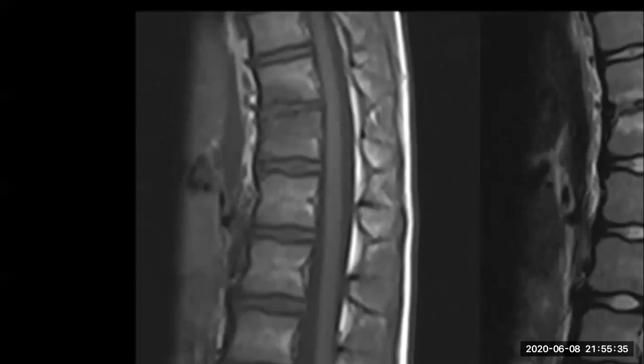If it were a single one, this is limbus vertebra, a normal variant, yes, but here there are multiple limbus vertebrae, so this is probably a young adolescent, okay? Any questions? Okay, thank you.